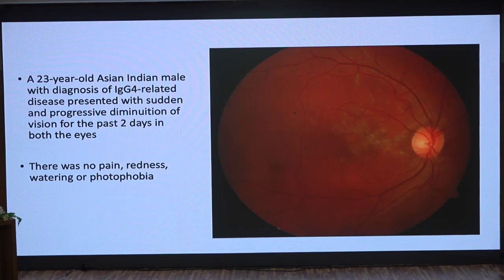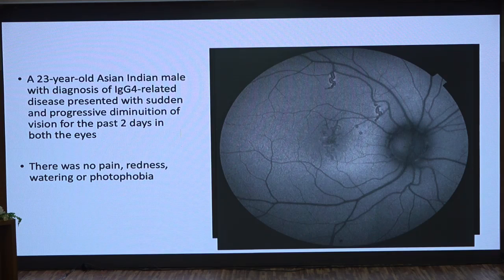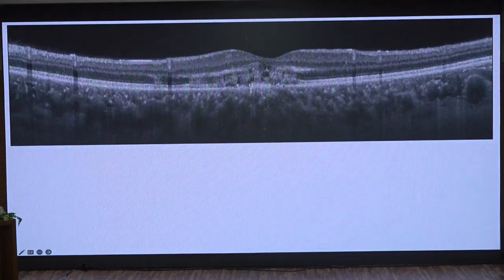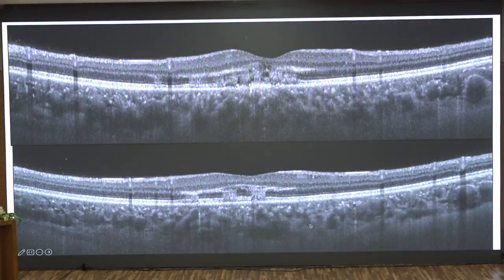So when you think of RPE, you get autofluorescence. Now autofluorescence shows these linear tracks. You cannot have these linear lesions either in retinitis or in choroiditis. So we do OCT through this, which again shows these column-like tracks. Look at these. These are very, very classic of laser-induced injury, with all those laser toys and laser markers going around in the market. This is very typical for laser.